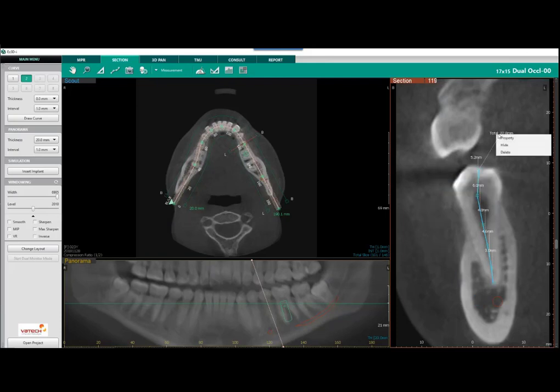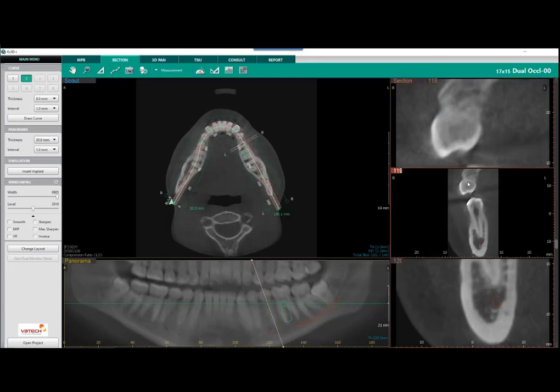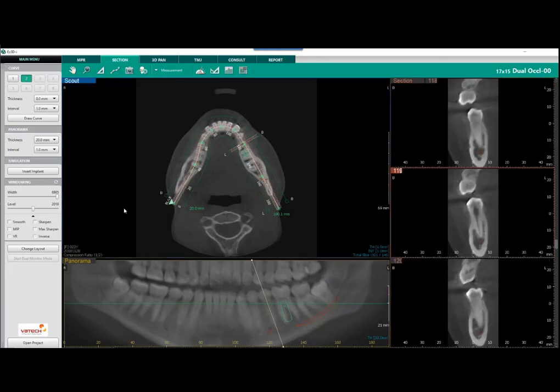And let's go ahead and right click and delete there. Paul, any other topics within the sectional window you think we should cover today? I know we're going to delve into this a lot more next week for all of our different clinical tools and doing a lot of adjustments here. I just want to give a brief overview of this window. Maybe show them how to delete curves.